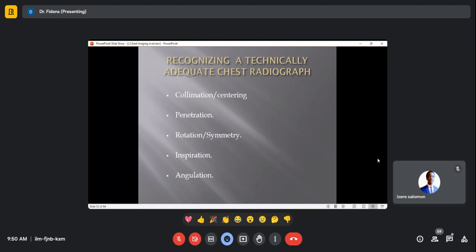We are mixing them. We have seen, guys, first of all, that you have to count them on the right side, that's number 1, not left. There is a reason behind it: remember the hemidiaphragms are not at the same level. That's the reason why I count only on the right side. That's number 1. Number 2, tell me.